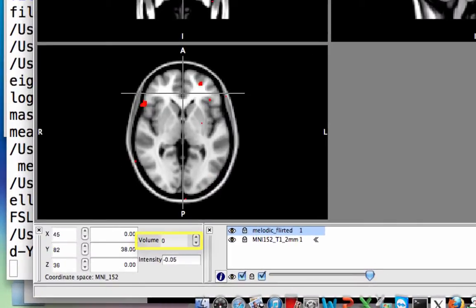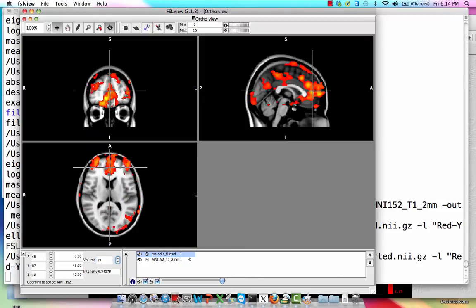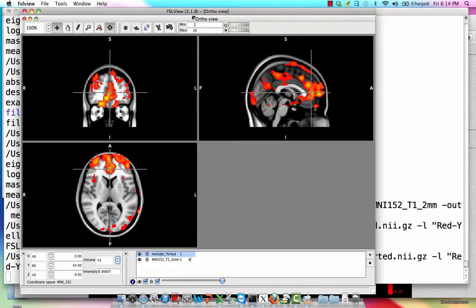So now that we have this here with volume, this is basically what we were doing with the HTML files, paging through those different independent components. Now we can just go through these different volumes to look at these different components in 3 dimensions, which is a little bit cooler, right? So again, we're looking for the resting state network, okay? And really, a lot of people just do this by hand, or they have a trained neuroanatomist do it, or they have me do it, which is a terrible idea, but I will do it if you pay me. So you just page through these, no, oh, okay, this looks pretty good, okay? We have a lot of this ventromedial, kind of more frontal PFC stuff. We also have some retrosplenial and precuneus activation. This looks like a pretty good map for a resting state.